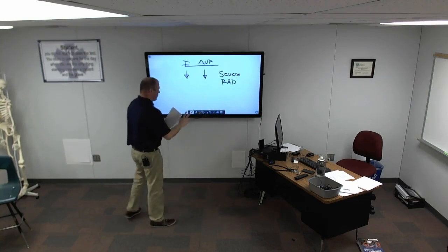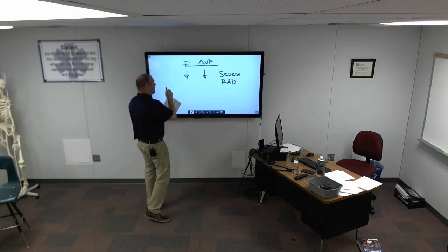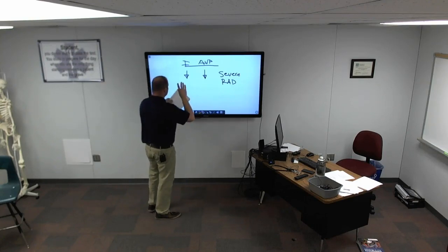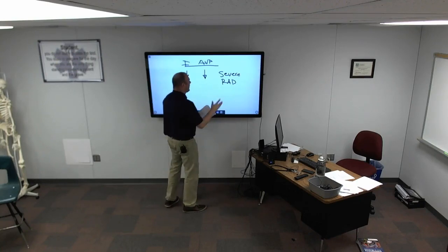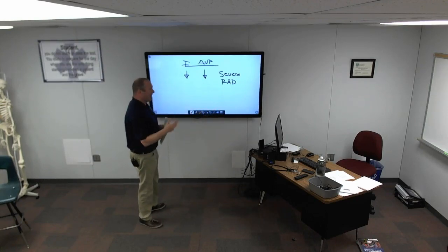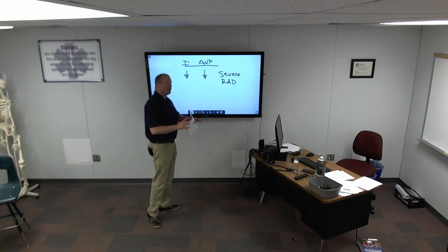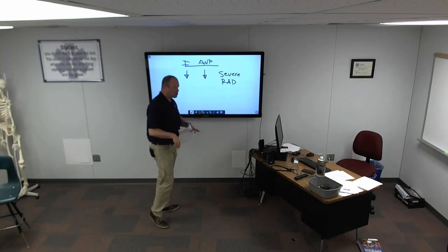Okay? So remember, both up is normal. Up and down is left. They've left each other. And then down and up is right. And then both down is severe right axis deviation. And that is the axis deviation part of when we're examining our 12 leads.